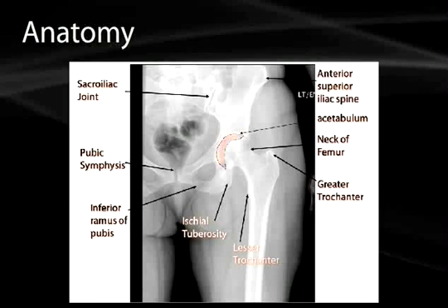The greater trochanter is going to be a major attachment point, and if there's a fracture anywhere on the neck or an intertrochanteric fracture, this could be pulled away from the segment, and you'll want to look for the lines of approximation. Here you can see the lesser trochanter, which is where the iliopsoas muscle is going to be attaching. Again, there can be avulsions of this.